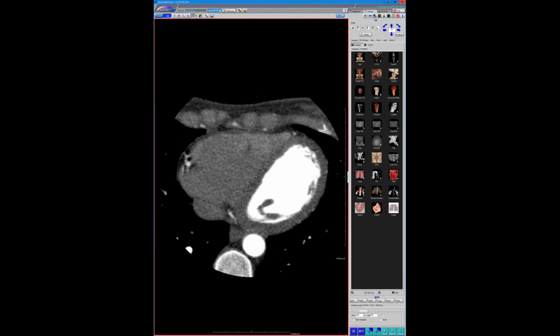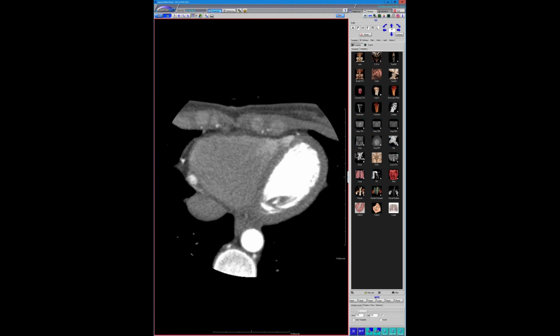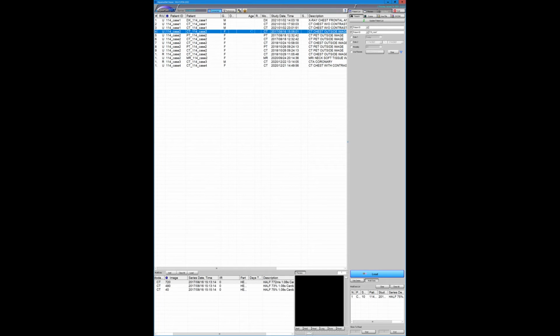And I asked one of my junior colleagues, and they said it could be a little hemangioma or some other hypervascular tumor, which again, I've not seen in this location, but I really thought that didn't make sense. And then she showed me this case, which I thought was fascinating.